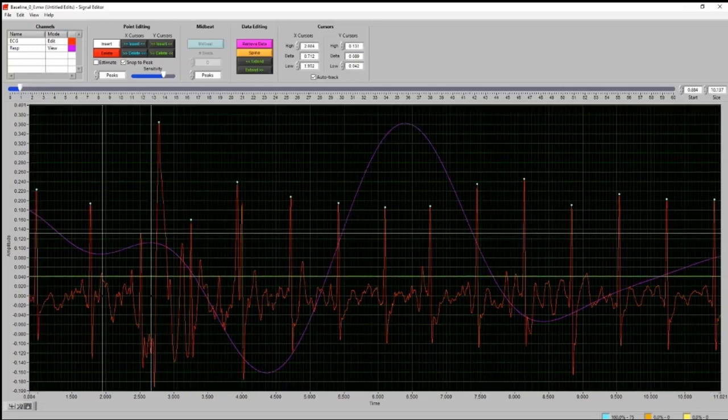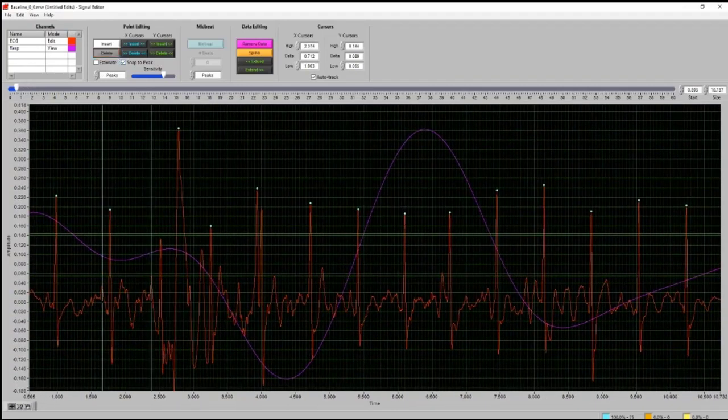So in this case, I'm quite certain that we're going to remove this artifact here, and we're going to place this beat where we can see it occurred, because we have these structures that do not look like the artifacts around them. Just even given the sharpness and breadth of the signal, this looks quite a bit different than the artifacts you see here.